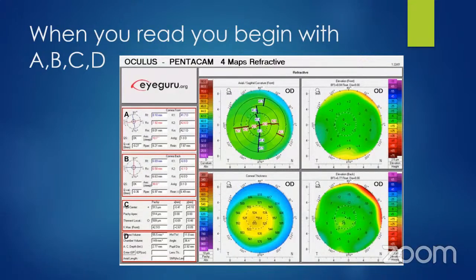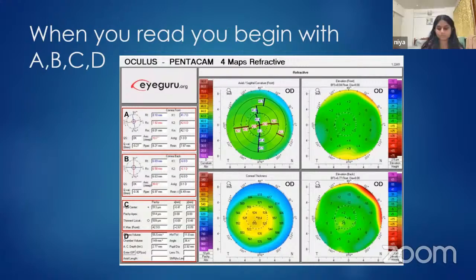And now we'll show you a few scans along with all these things that we were telling. Just want each person to talk about it briefly so that we say what that scan is. Okay.